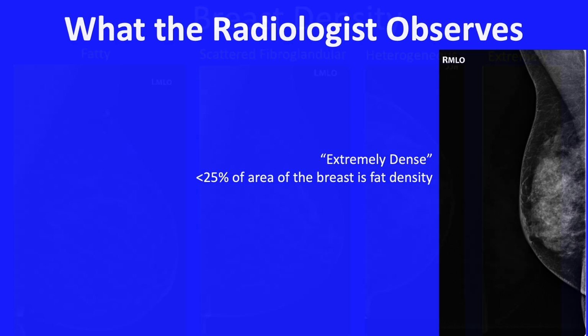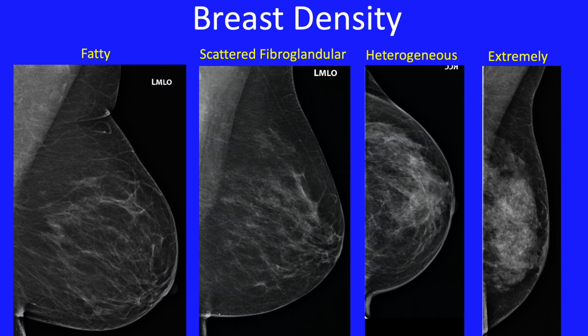I have now combined all four types of breasts in one slide so you can compare, and yes, realize that the classification is open to investigator interpretation and bias. AI will likely minimize confusion in the future.